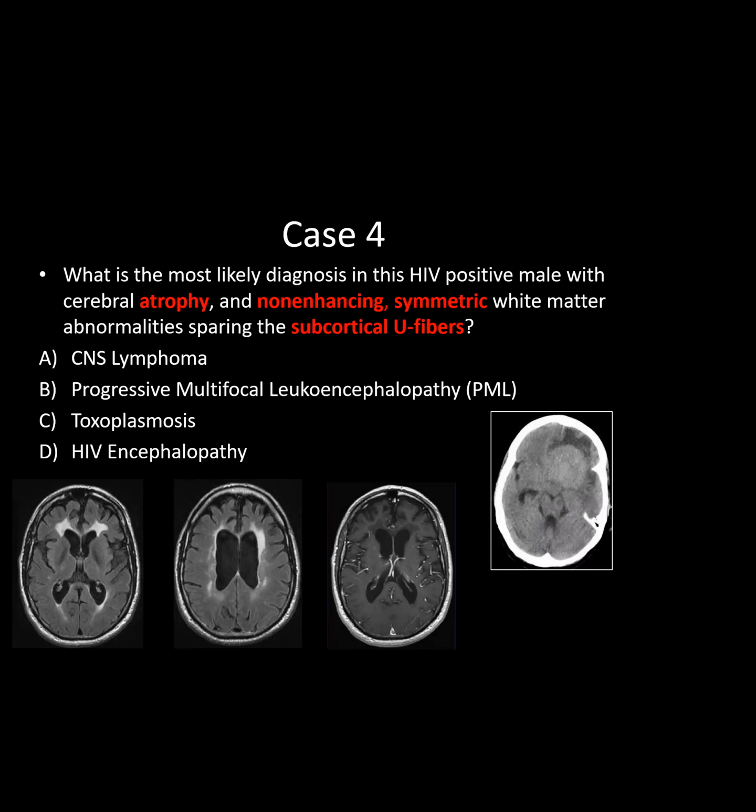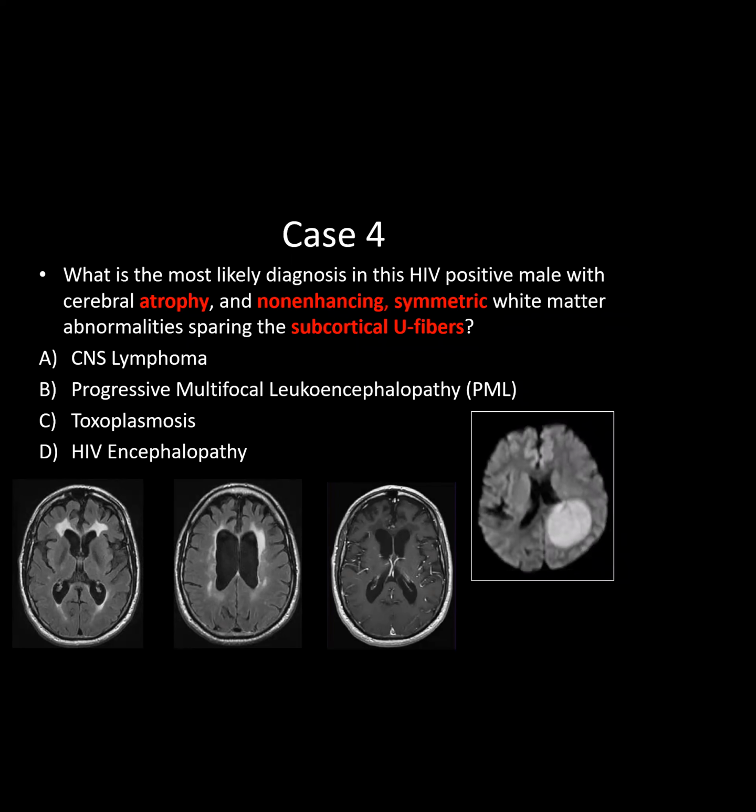And it's densely cellular. I showed an example of this before. Because it's densely cellular, it'll often be bright on CT and it'll often restrict on DWI. And this is a tumor besides a glioma that likes to go into the corpus callosum as well, which this lesion is doing actually.